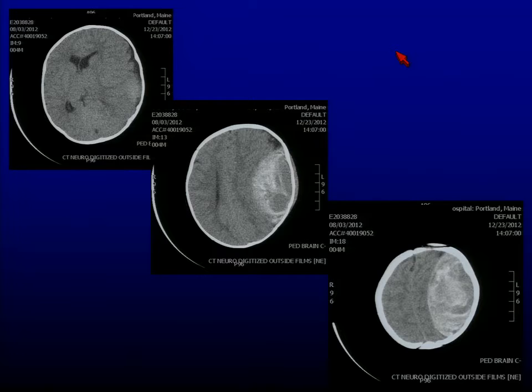And then every year I have my favorite CT of the year to demonstrate a principle. So this is a 4-month-old I saw on December 23rd, 2 days before Christmas in 2012. It's a 4-month-old who came in with a right gaze preference, who the story was had rolled off the changing table. And the kid was worrisome, but not sick, eyes open looking at us, just neglecting their right side.